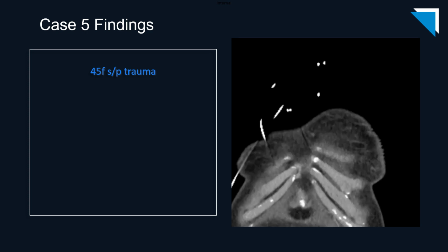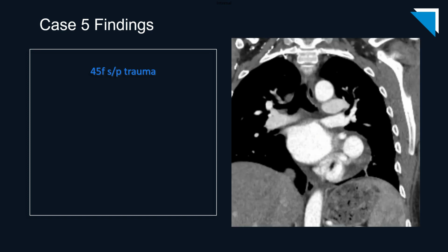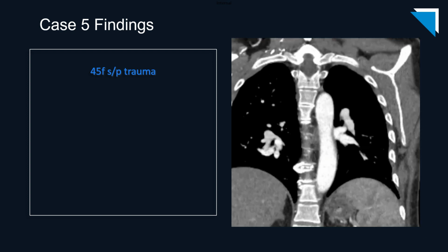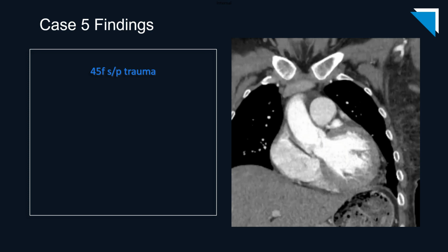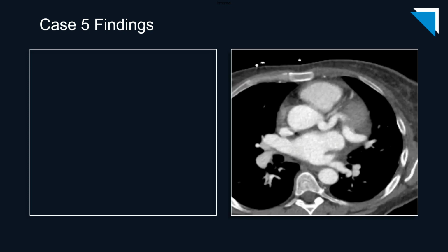Here are the coronal images from the same study. Reviewing our findings.